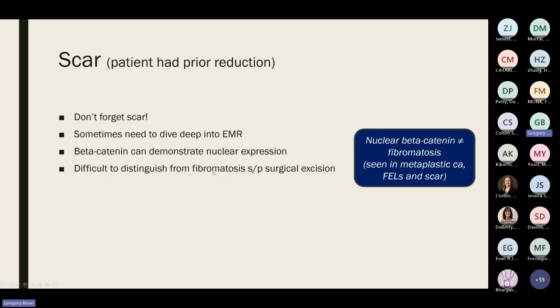It's actually scar. It turns out the patient had a prior reduction. So don't forget scar. Sometimes you have to dive deep into the electronic medical record to find evidence of some sort of procedure. Just remember beta-catenin can be positive in scar.